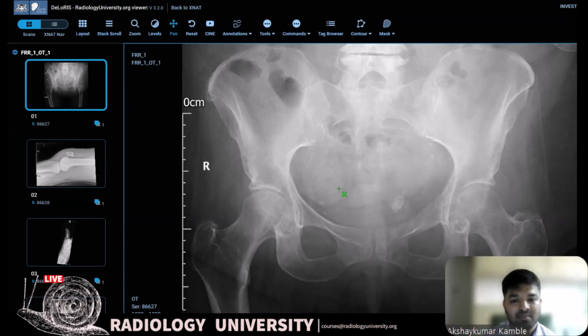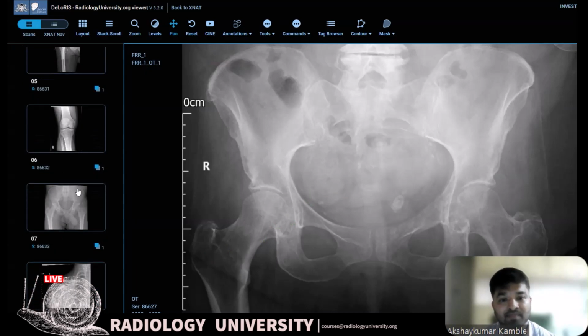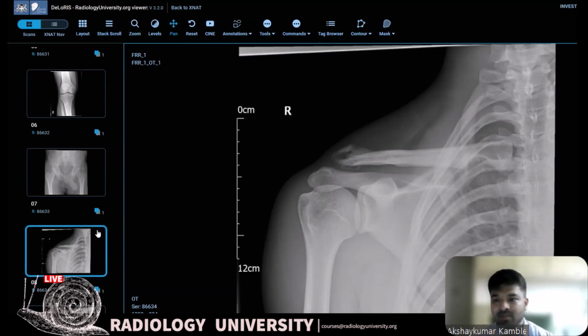That's how they screen the x-rays to put them into rapid. People go through every x-ray and judge whether it has only one abnormality, or if it's a normal one, which is actually more difficult to pick because it should not have any abnormality. That was a good question. And what are these? Phlebolith. Yes, central lucency could be phleboliths. Okay, so we'll go on to number 8.